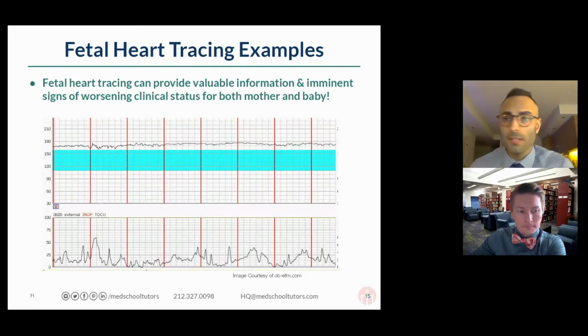Who here can tell me what they think of in terms of the fetal heart tracing? What is concerning? Okay, excellent. So Mario Mikel said fetal tachycardia, and that was right on the money. That was very fast, and I love that.